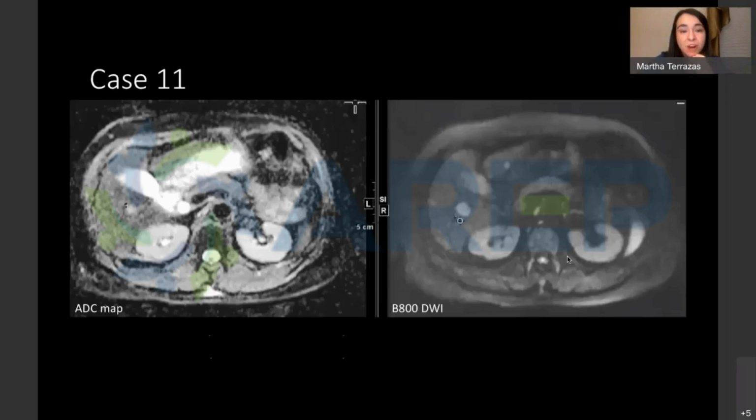They biopsied. Oh, sorry. And then we have our diffusion-weighted imaging. And the reason why it was read as not metastasis is because it doesn't look like it has restricted diffusion. It's not dark on our ADC map. Yeah, it's bright on our DWI, but they were thinking that was T2 shine through, which you can see with cystic lesions, because you want it to be dark on your ADC map. So they said, oh, there's not restricted diffusion in this, so it's probably not malignant.